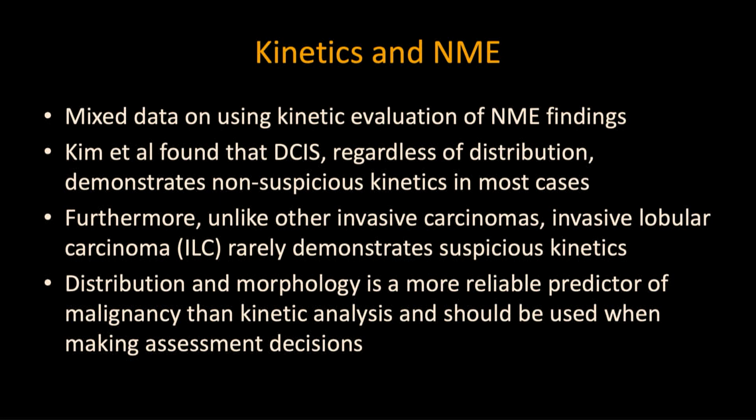So kinetics and non-mass enhancement, there's mixed data on the use of kinetics with NME. A study by Kim et al. found that DCIS, regardless of distribution, demonstrated non-suspicious kinetics. So always look at your most suspicious finding. If that's morphology or distribution, that's going to be a more reliable predictor of malignancy than kinetic analysis.